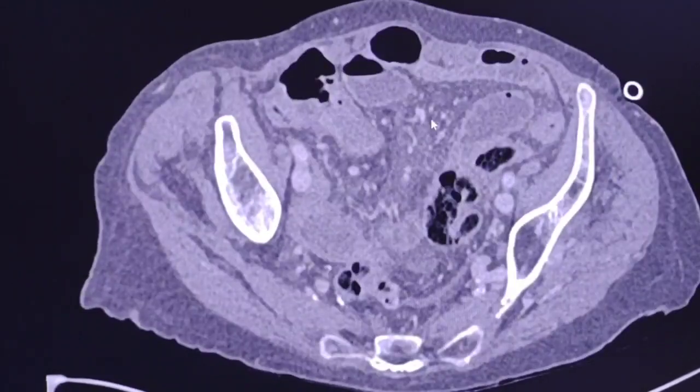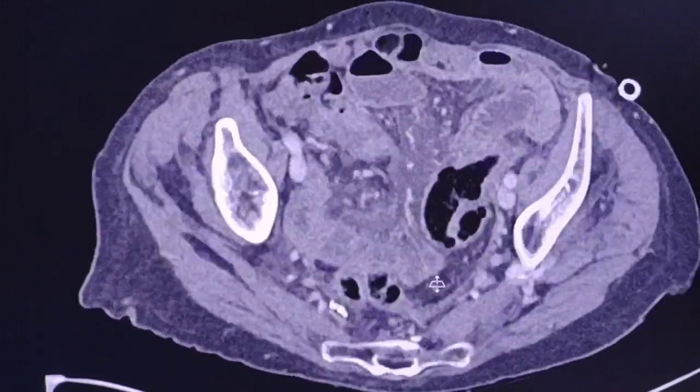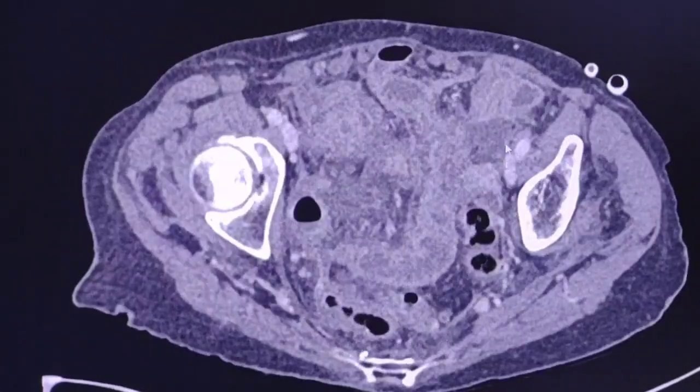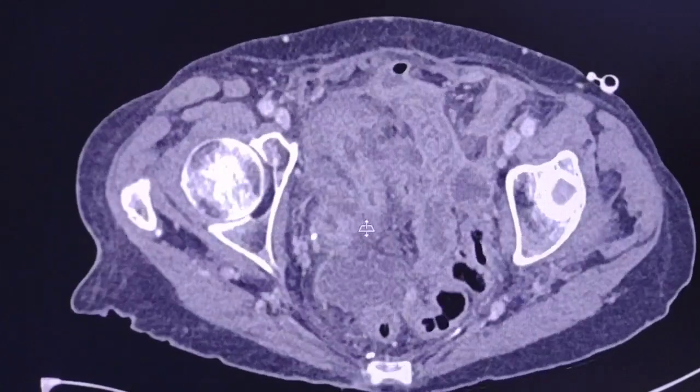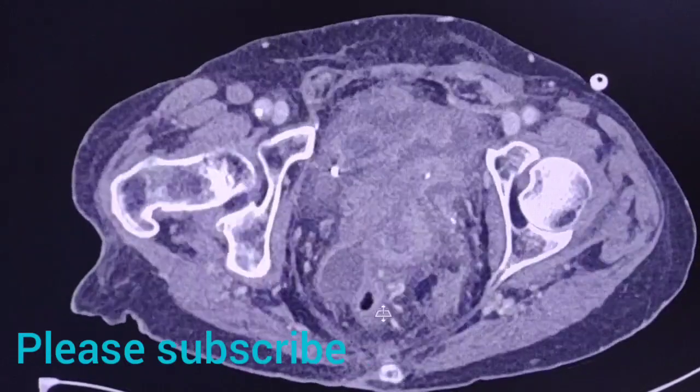As you can see, there is fat stranding, significant fat stranding, which is suggestive of ongoing inflammatory changes. There are traces of fluid here and there. Here, all this is fluid. Here is a quite big collection in this region.